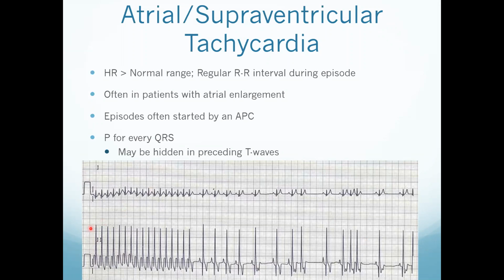But in some dogs, if they get particularly rapid, they can definitely cause clinical signs like weakness, collapse, and hemodynamic compromise, and might need to be treated acutely.